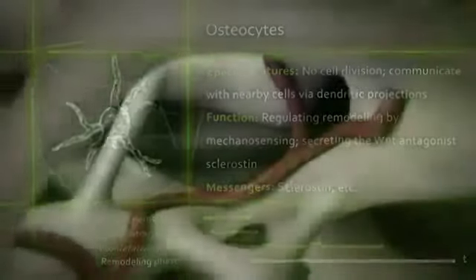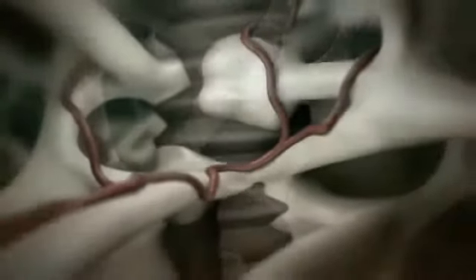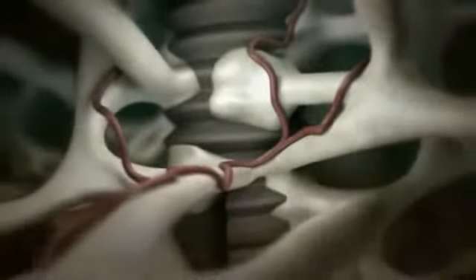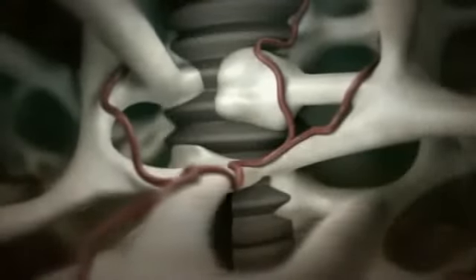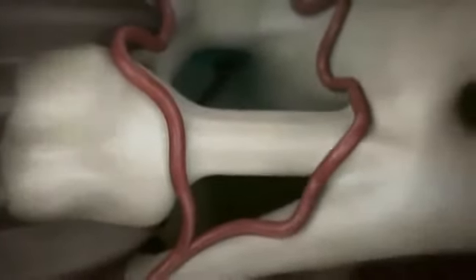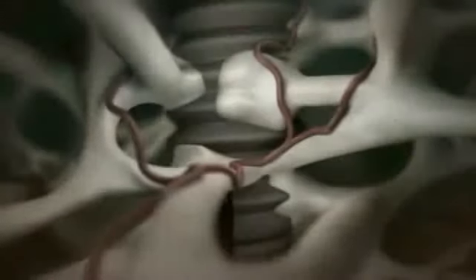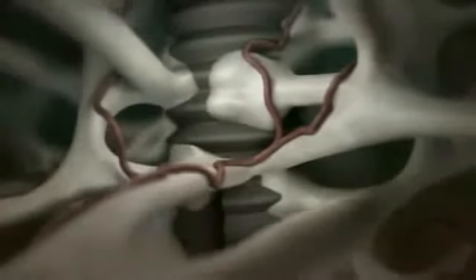Lamellar bone structures are formed. Similar to the arches and vaults in a Gothic cathedral, they absorb the stresses of occlusal load. We are back at an efficient trabecular bone meshwork, perfectly adapted to the new situation. Osseointegration, a highly complex biodynamic process of cell-to-cell communication, is completed.